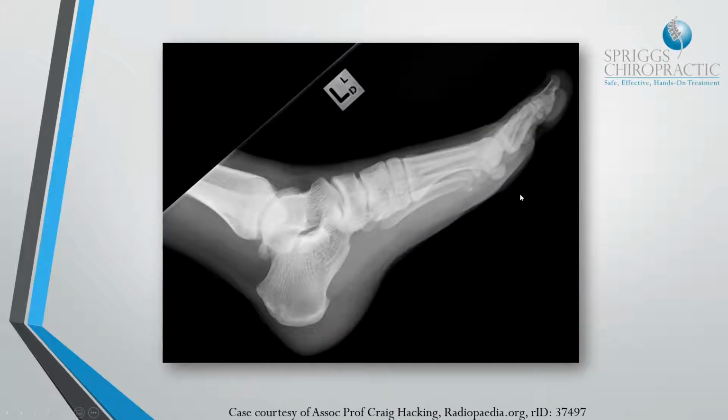So here is the basic overall projection, and it gives you a great view of the main body of the calcaneus, which is obviously missed on the dorsiplantar projection. The axial calcaneum view, just to really hammer this home, is taken dorsiplantar, but it has an oblique projection that comes all the way through from about where the Achilles tendon attaches onto the calcaneus, and it allows you to evaluate the main body of the calcaneus through a dorsiplantar projection.